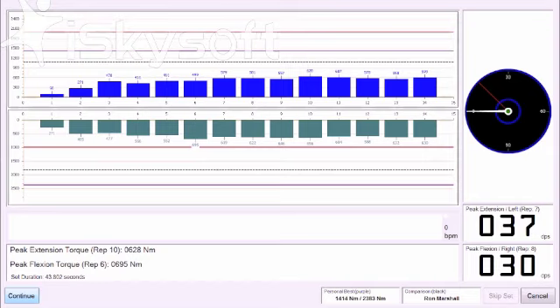One of the standout features of the reporting system is that this system can record your personal best scores. You'll notice along the bottom tab it has personal best, extension and flexion. These values directly relate to the purple lines that you can see across the screen. Each purple line gives an individual exercising on this system real-time feedback to be able to compare and challenge themselves to try and better their previous personal best scores.